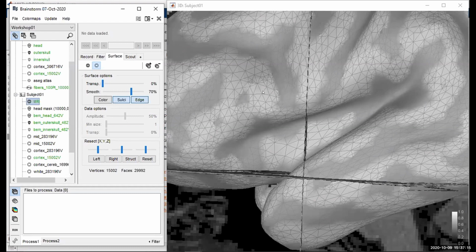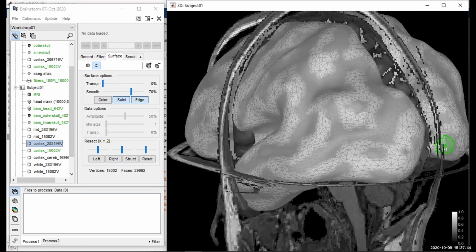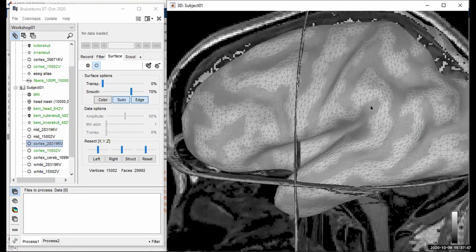And so when you're, for example, segmenting an MRI file using FreeSurfer, it will give you a Cortex file that has hundreds of thousands of vertices. So this has a super high resolution, which is great. It will look great, but the downside is that your computer will struggle, first of all, to just render it in record time. And if you want to start interacting with your surface, moving around, zooming, and so on, obviously the higher the resolution, the slower the computation will be.